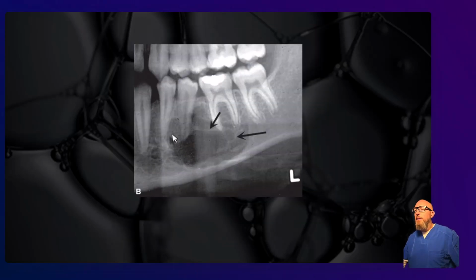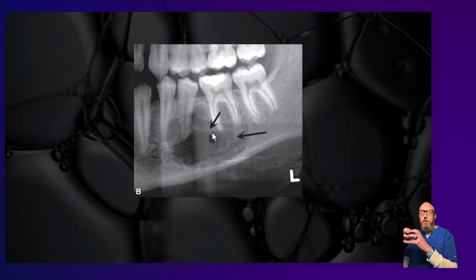All right, what about this one? Well-defined or ill-defined? Does it look like something malignant or benign? You can see some cortices right here as it outlines this lesion. And what are the arrows pointing to? Septations in it. This is one of our MACHO lesions. But what type of septation? Is it the soap bubble appearance, nice round coarse appearance of the septation? Is it more the X shape? It kind of does have that straight septation appearance.